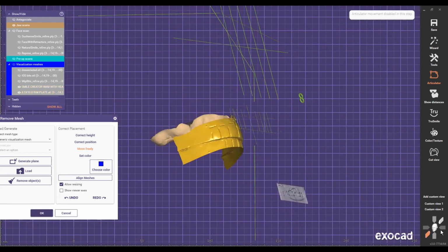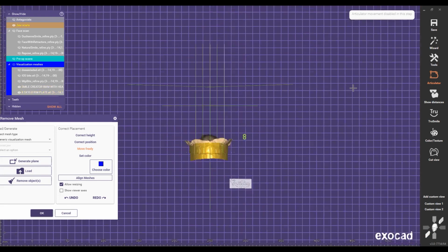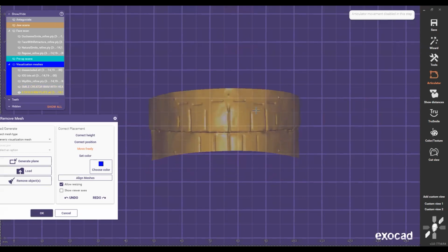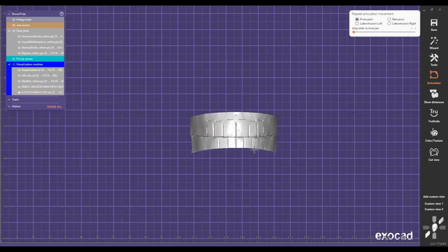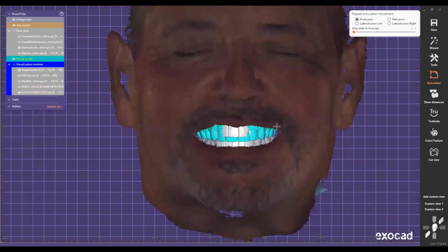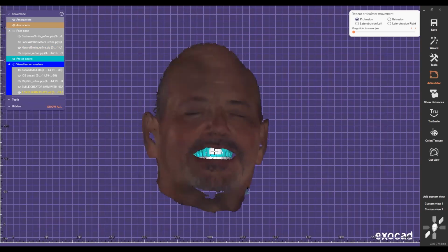Now I want to make sure that my wax trim doesn't look like it's going to be off. It's going to be canted. So I'm going to check this dot right here, and then just make my changes. Now everything is matched to the background lines, so that tells me it's good. So now I can just say, okay, now I'm done. Everything is set, right?